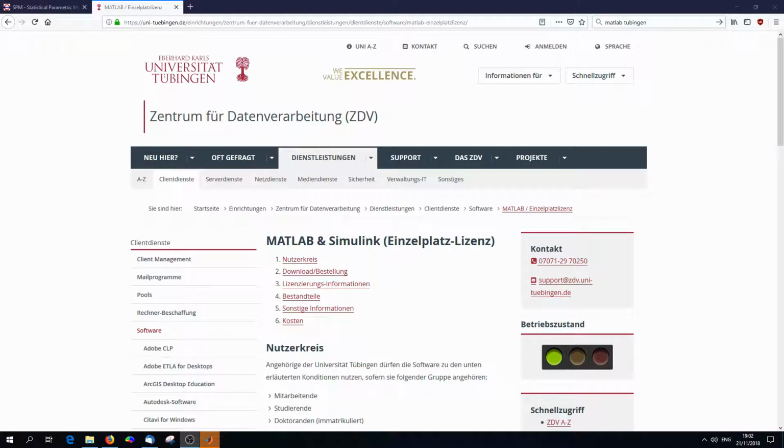Dear students, welcome to the third tutorial of the lesion to symptom mapping lecture, and today I show you something more special. You might remember that we got through lesion to symptom mapping in tutorials 1 and 2, so today I'm going to show you something that's not directly related to lesion to symptom mapping, but as I promised, I show you how to load and process brain images in MATLAB using SPM algorithms.